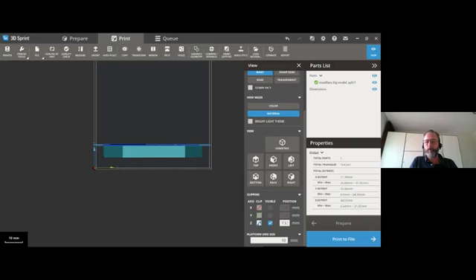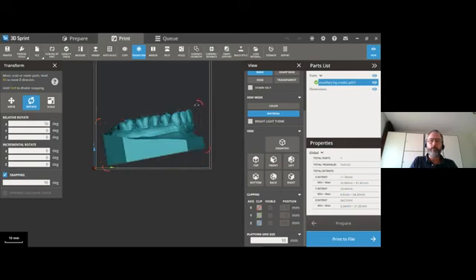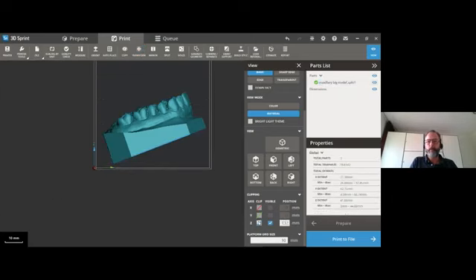I will just get rid of this. You can go to transform, rotate the part. Snapping is 10 degrees. So if I take the part and I tick 2 times, that means that I've now selected 20 degrees. You can also type it in. Then we go back to this.